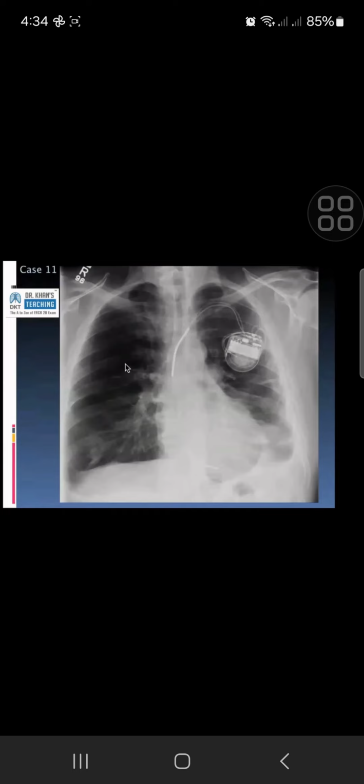Okay. This is a chest radiograph of an adult patient. I can see that there is opacity within the left lower zone, which is blunting the left costophrenic angle. There is a little bit of pleural thickening extending superiorly as well.